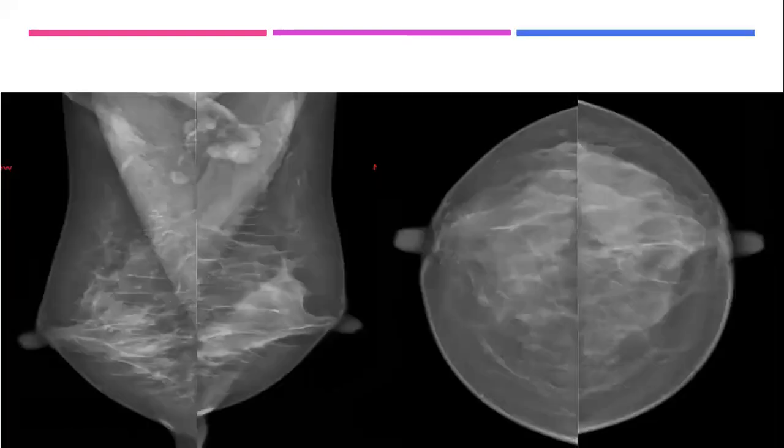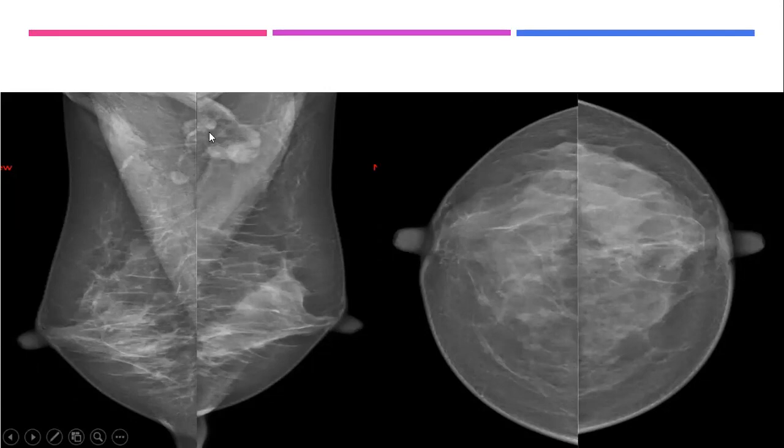They had done the mammography and rediscussed the patient, and the ultrasound and mammography at that time were reported as normal, because really it is subtle findings. And if you look at the lymph node, it has abundant fat, but still it was metastatic, look at the asymmetric cortical thickening. See?